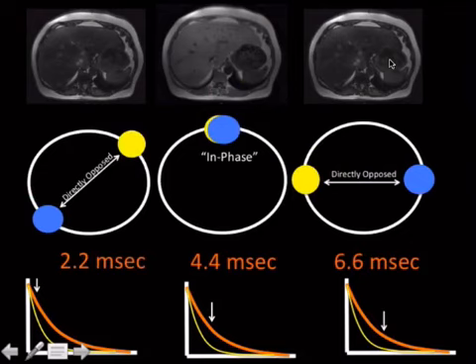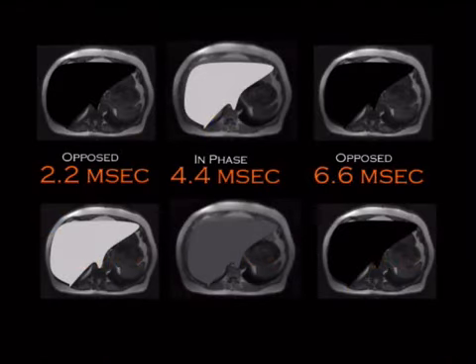All right, so now I've added the MR pictures here, and this is fat. So opposed, it's out, in, you see the signal return. Opposed, it's out again, and the next one would be in, right? But what if we look at what would happen with the iron in the liver from the T2 star? That's the bottom row. Notice that as time progresses, it gets progressively darker. More and more T2 star effect.